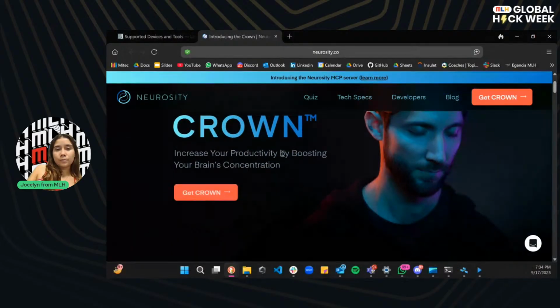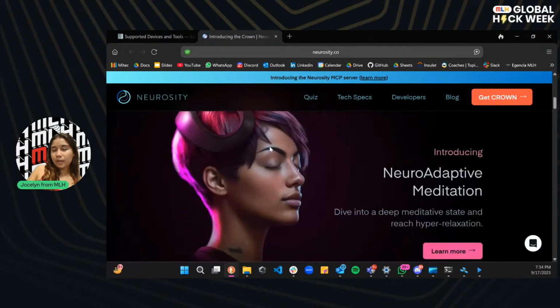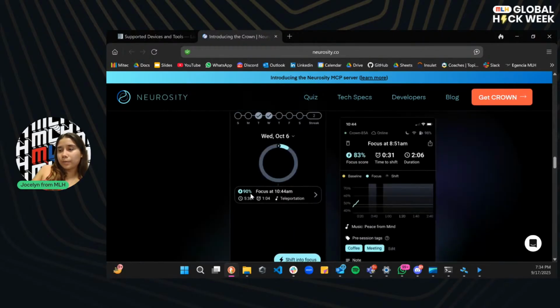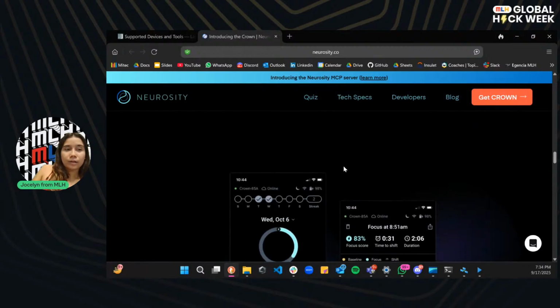Great. So this is the one that we're going to be using today. It looks really nice. It looks like from the future. It actually has an app. I can open it up from my phone. So let me see it. There we go. So this is how it looks. There's a complete app on my phone.